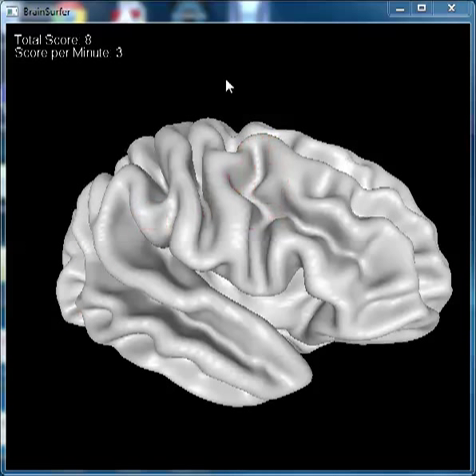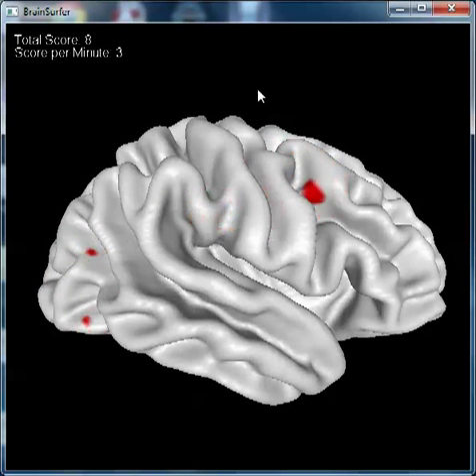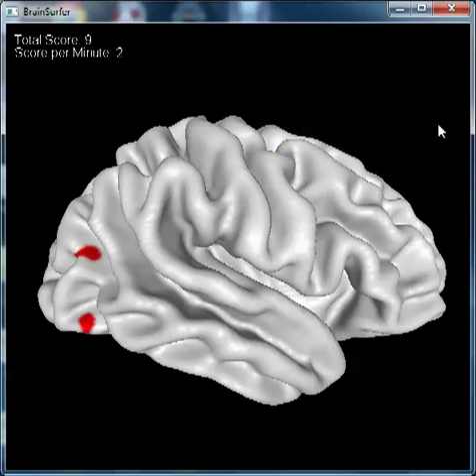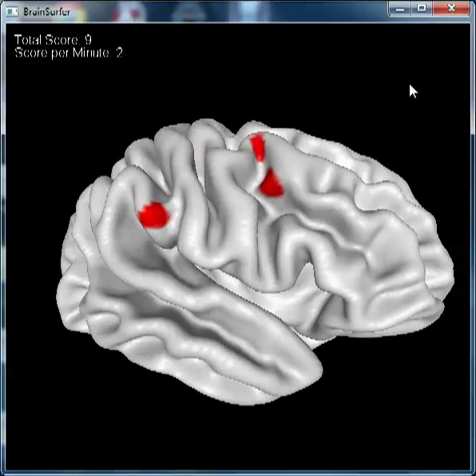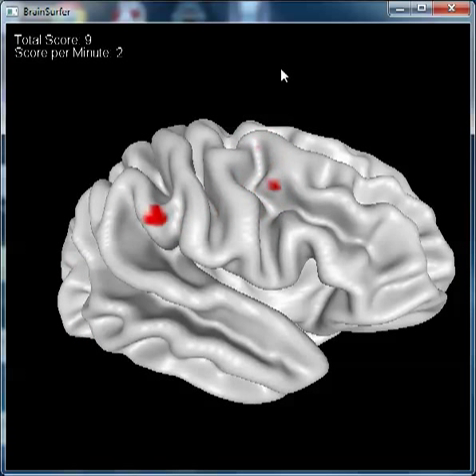And what we're seeing at the surface here is the movement of the activity across the surface of the neocortex that is generated by the Brodmann areas that constitute the dorsal attention network. We can move the brain with a mouse. We can move it up and down and adjust it so we can view what we wish, because the goal here is to try to isolate and focus on the most deviant and dysregulated parts of the brain, and through brain-computer interface technology to then train the patient, get the patient to modify their own brain through operant conditioning and reinforcement when the brain is in stable states.